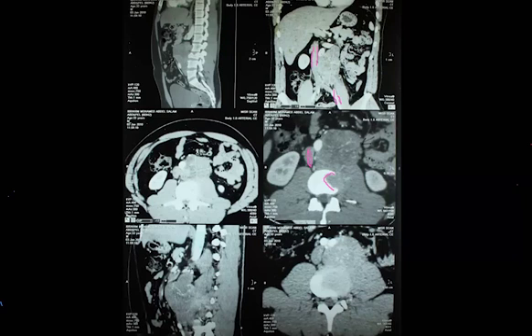Okay, do you think this is cystic, Mona? No. You don't think this is cystic? Why don't you think it's cystic? Because it's heterogeneous and irregular. Because of its density. This is not the density of fluid, exactly, to our basic minds. Be cautious a bit when you diagnose a cyst or no cyst, but I don't think this is a cyst. We don't think this is an abscess.